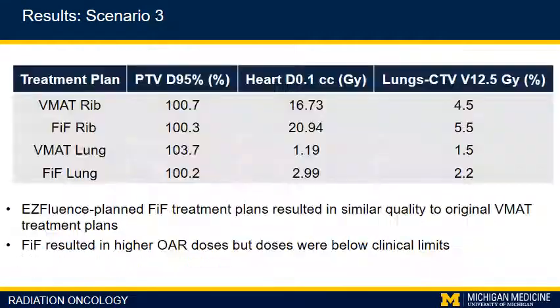A comparison of the VMAT and field-in-field treatment plans for the multimetastatic thoracic scenario are shown here. The EZFluence planned field-in-field treatments did result in similar quality to the original VMAT treatment plans, although they did result in higher OAR doses, but once again, these doses were below the clinical limits.